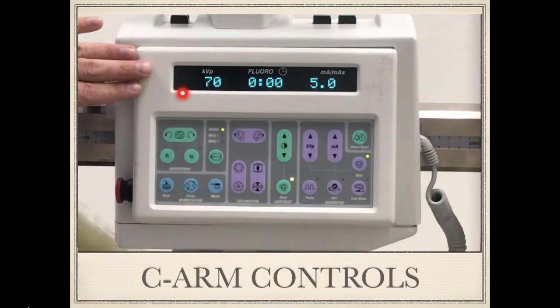The top two buttons, which are these ones, rotate the image in either direction by a small fraction, say about 1 degree. And the lower two buttons, which are these two, are to do with the mirroring of the image, or reversing the image. So this is how you see the image on your screen.